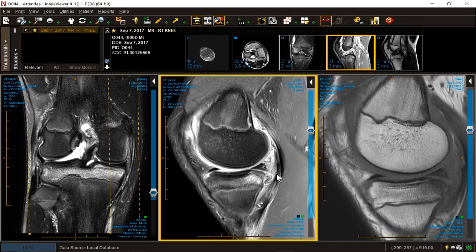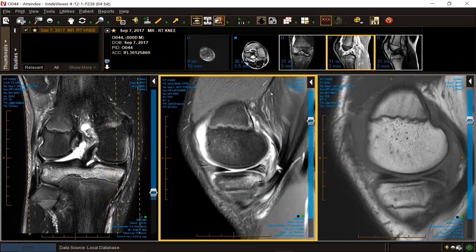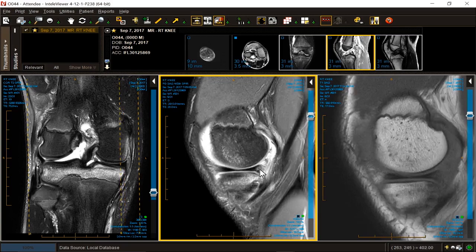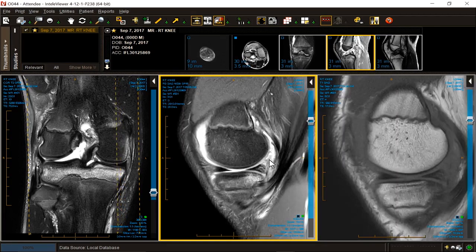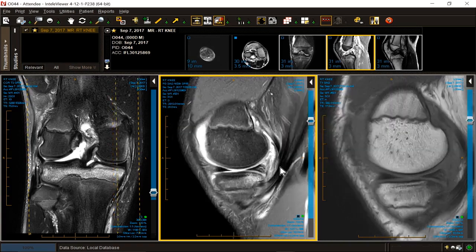Now let's move over towards the capsule. Remember we said the posteromedial corner has a posterior capsular component to the meniscus and an oblique popliteal component. How's our oblique popliteal component looking? Not so good. Right there. It should be a nice, firm, straight or curvilinear arc-shaped black structure. It's not. In fact, it's torn right there. And we're on the posteromedial side. And look at this portion of the semimembranosus insertion.